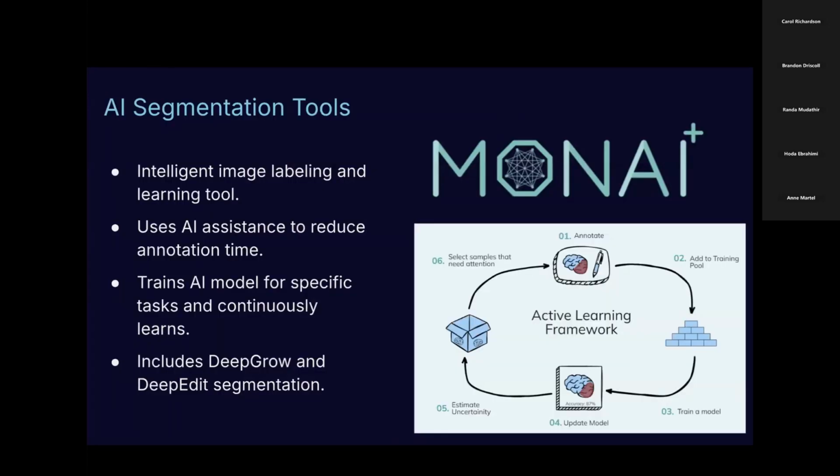So far we've looked into fundamentals of segmentation tools, and then later we looked at some GPU GrowCut based implementation that we have. So I'm going to talk next about AI-driven segmentation and what tools and capabilities we have in this area. One important aim for us has always been to try to make OHIF Viewer as lightweight, modular, and extensible as possible. That means we want to limit the amount of backend components that you need to run OHIF Viewer with, which at the moment is zero. You don't need a backend to run OHIF Viewer.